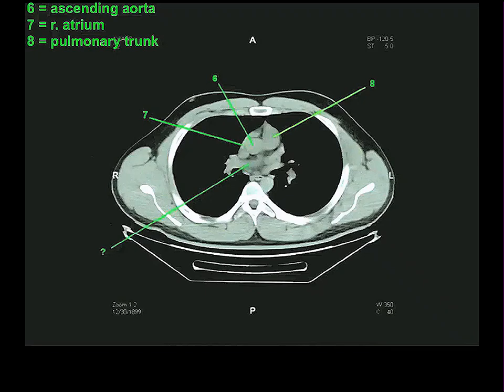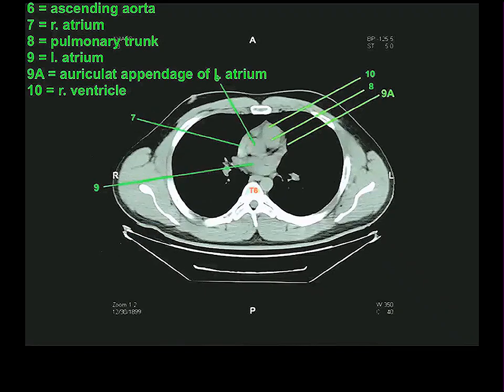They're going to blend with one another. And if I go down one, I clearly have left atrium. So I didn't know right at the boundary between them what I was seeing. Here's still ascending aorta, hasn't changed, pulmonary trunk. I've decided that this little most anterior part of the shadow of the pulmonary trunk is probably where the right ventricle empties into the pulmonary trunk.